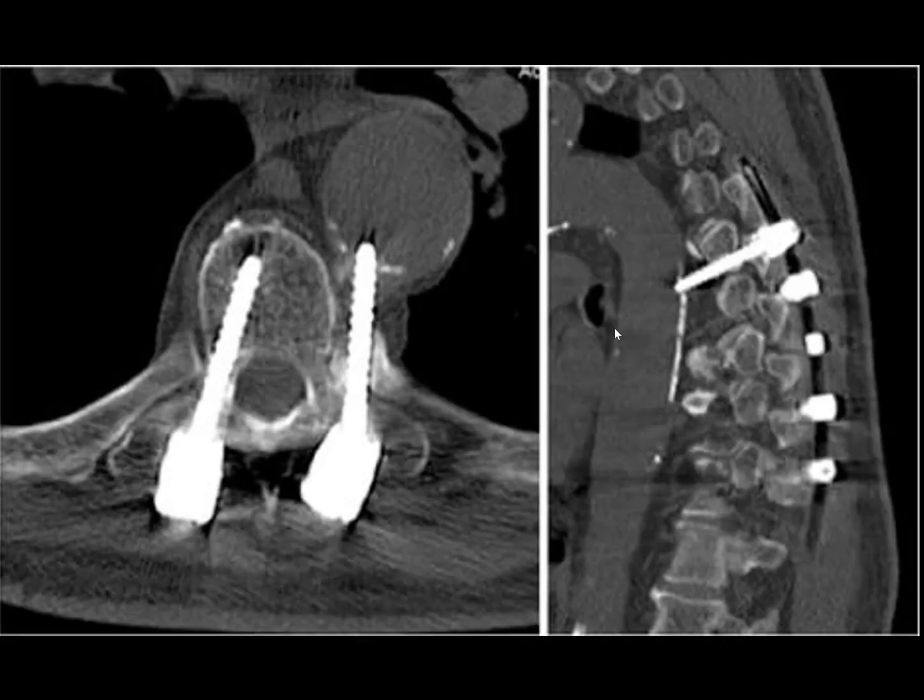Yeah. Right. So the other thing is in the thoracic spine, especially on the left, you also have to be cognizant that, you know, the natural tendency is, well, you don't want to put a screw in the spinal canal, right? So you want to be lateral. Well, if you're too lateral and too long, you can hit the aorta, which can be catastrophic. You can kill a patient. Patient could die. You can see the screws in the aorta.